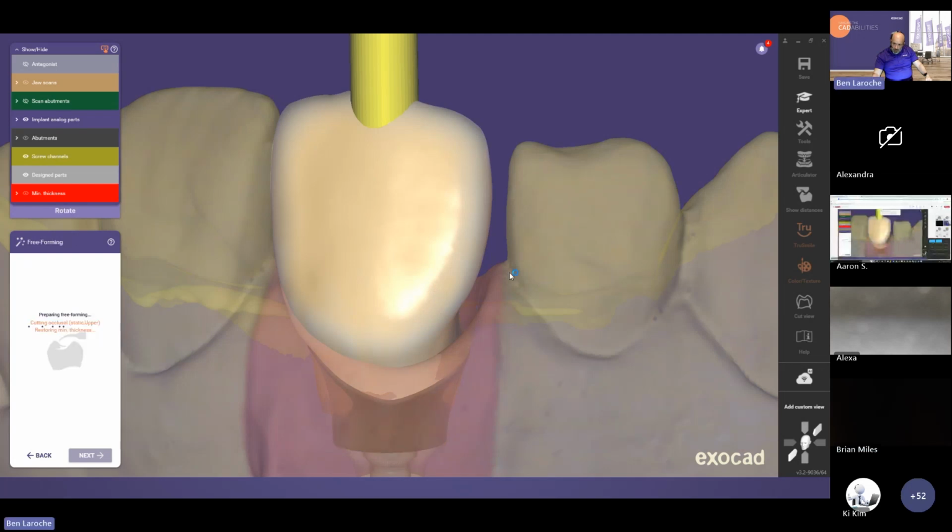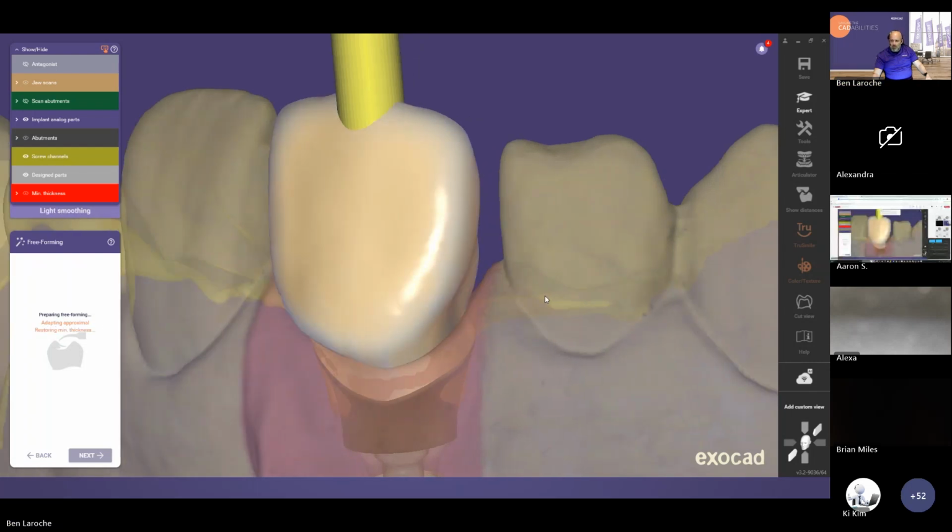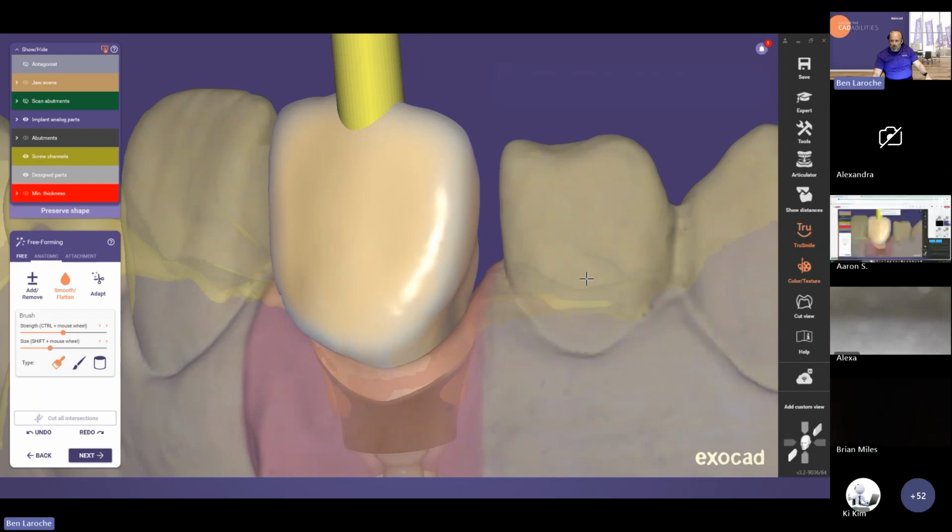And as you can see, I've not done the ideal crown or anything like that to go over it. I am no longer the professional I was, and I'm counting on you for the help.